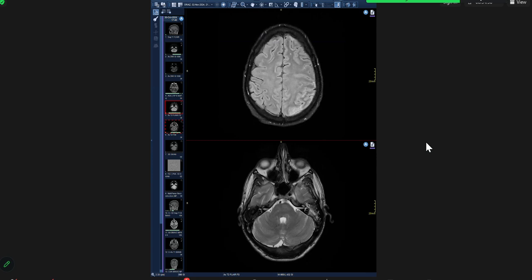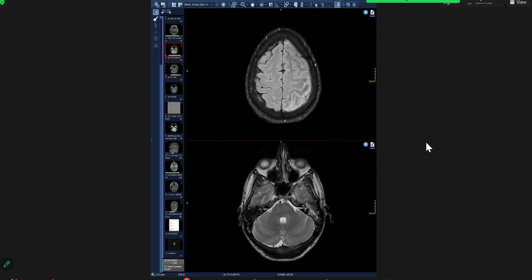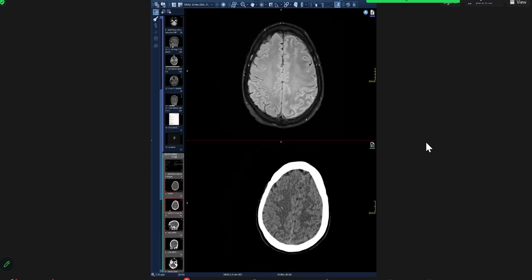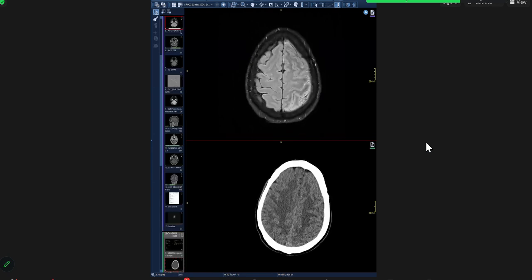And you would always want to look at the CT of this patient to see whether they saw blood here. If you had asked me whether there is a CT for this sulcal FLAIR hyperintensity, I would have given you the CT. So this is the CT, and here you don't see blood, rather you see this kind of fluid signal. See that? Yes, ma'am. So there is no hemorrhage. Hemorrhage we have excluded, but there's this sulcal hyperintensity.